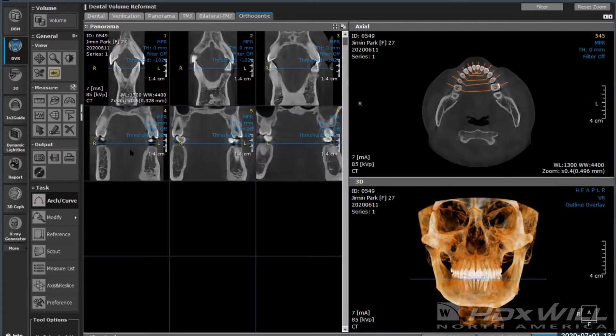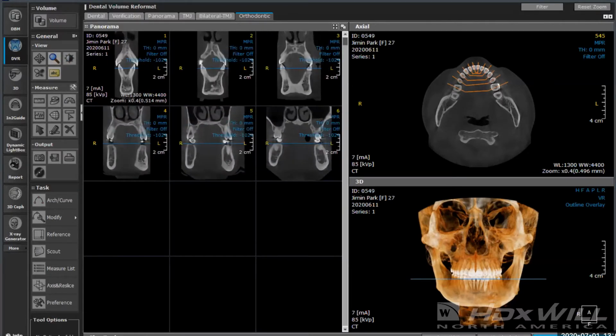And so it gives you, again, some nice tools to be able to not only look at it, but to be able to slice it through at each level of teeth bilaterally, to be able to see how they interact all the way through the mouth as well. So it's just a nice tool to give yourself one more way to make that analysis on their occlusion and how those two teeth interact.